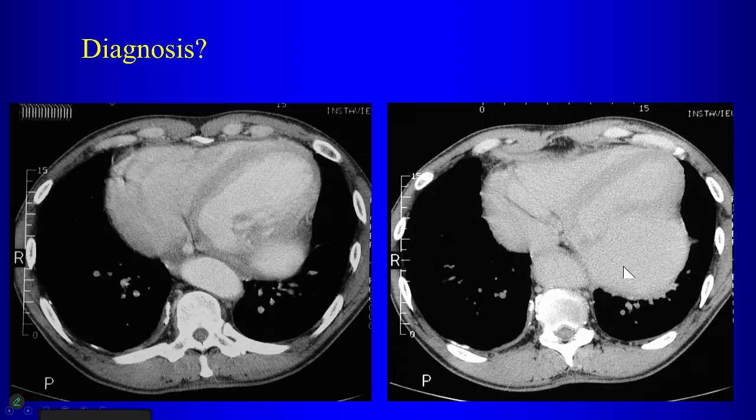As opposed to a true aneurysm, which has a wide mouth. So what is this out here? What is this? Is that the cardiac? That's pericardium, right? So a false aneurysm is a contained perforation of the ventricle. So this patient has perforated the ventricle as a complication of their infarct, and what's containing everything now is the pericardium. So the treatment for this is surgery, right? Because the risk is rupture, and of course the patient will exsanguinate, okay?